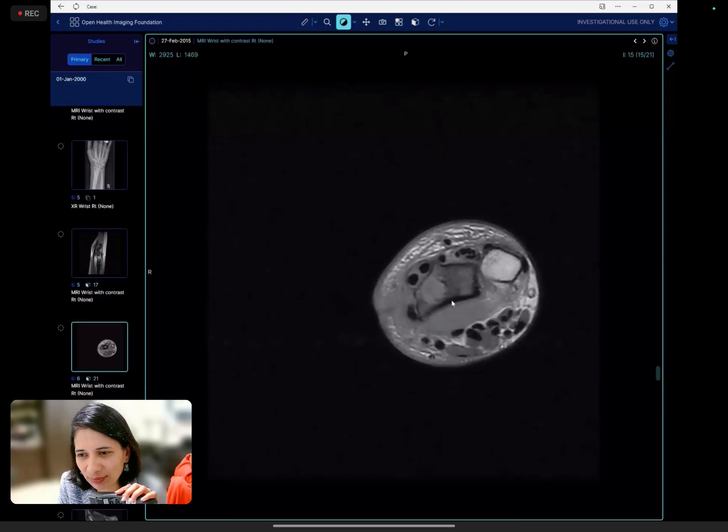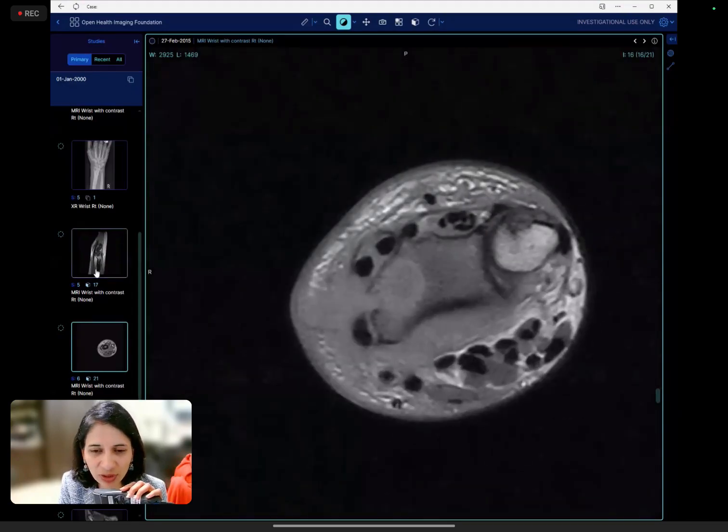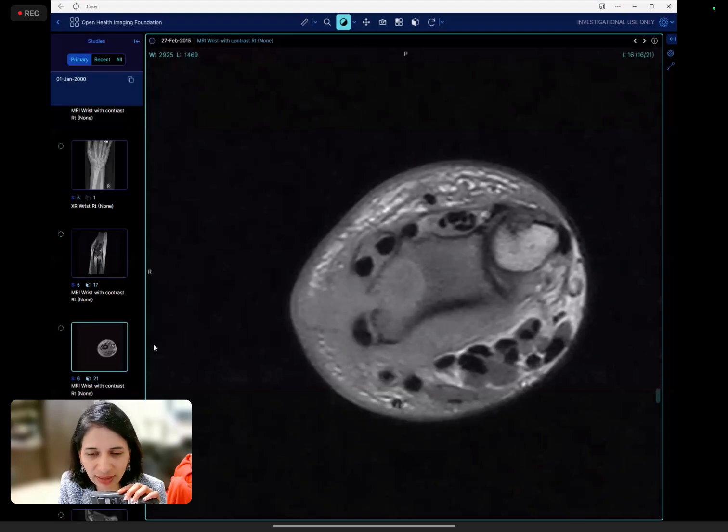So I think you described this very well, because each examination I'm showing counts as one. So you can't say that, oh, I saw only three films, three cases. Each examination is one encounter. So this is one, and then they show you the MR. You have to describe the MR. So although it is like three cases, you have seen four or five examinations, because you have seen different modalities, and because they want you to say what's happening here.